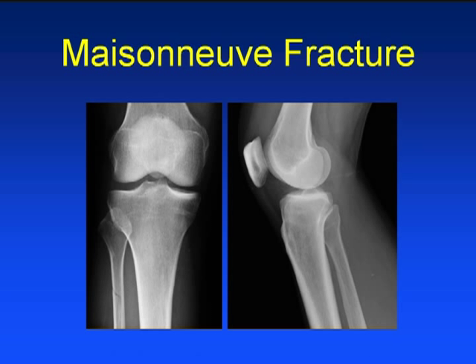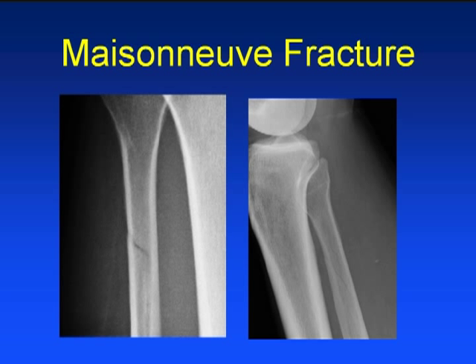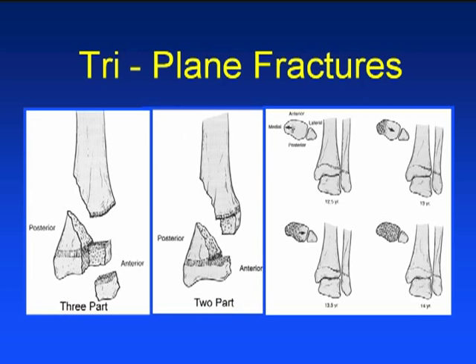And if you guys are like me, just in a practical sense, tib-fib studies tend to be normal. I don't know how many people in here read in the emergency room, but tib-fibs, just like T-spines in 20-year-olds, tend to be normal. So the big game here is not to miss the subtle fibular fracture, which is right there, because at some point someone will blow it up really big like that, and then it gets a whole lot more obvious. That's just frustrating to find, when somebody else is showing it in a large format. But if there's injury at the ankle, be aware of the Maisonneuve.